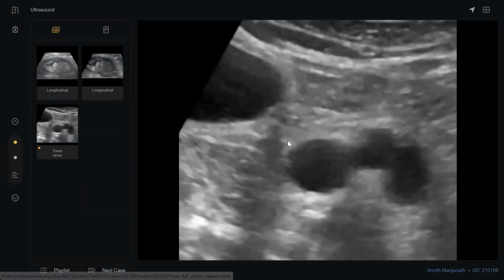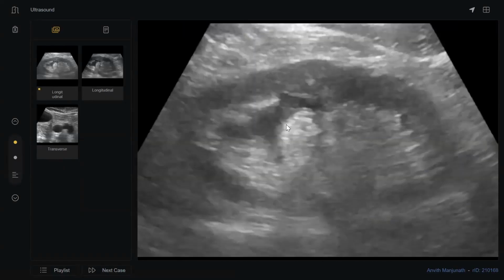You did very well, but take a home message. This is the ultrasound here. Actually, no obvious air, really. Just dilatation in one part of the calyceal system. Is this considered upper or lower? There are no markers here. The middle calyx is normal, the lower is normal. This is the fat, the central sinus fat.